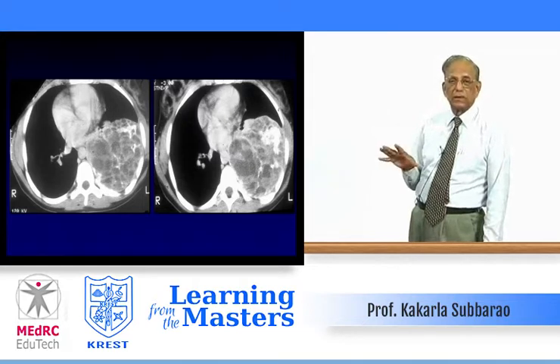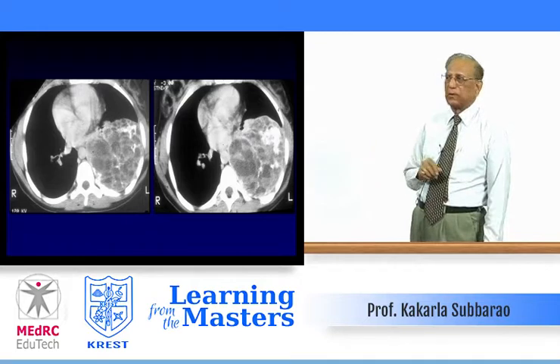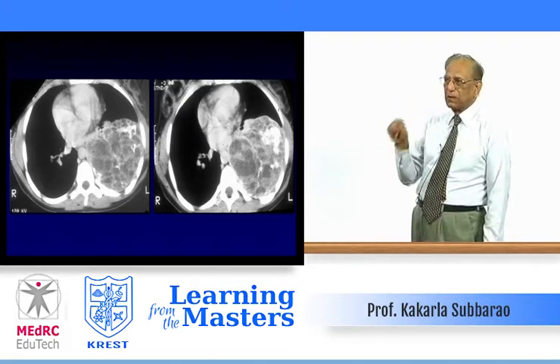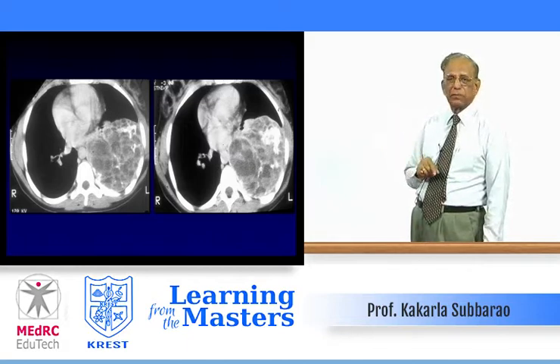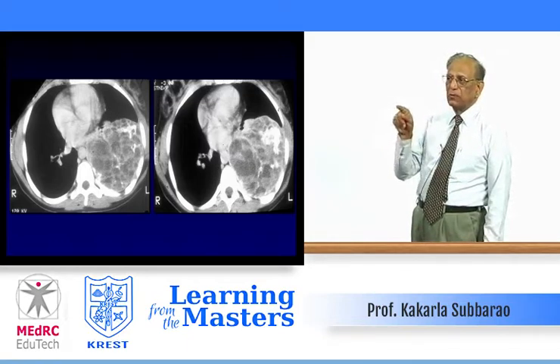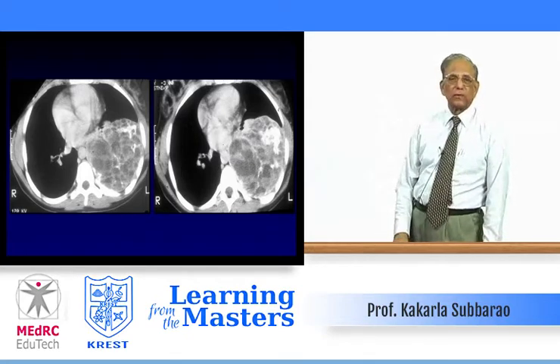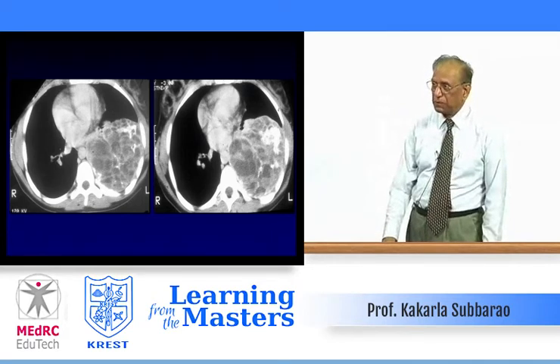In these cases, CT is essential to find out whether it's pleural, parenchymal, or extrapleural, namely in the bone or in the skin and subcutaneous tissues. You see that mass contains lots of bony spicules and septae, and fluid levels also. The rib is thinned out, aneurysmal bone cyst. Again, I'll show you.